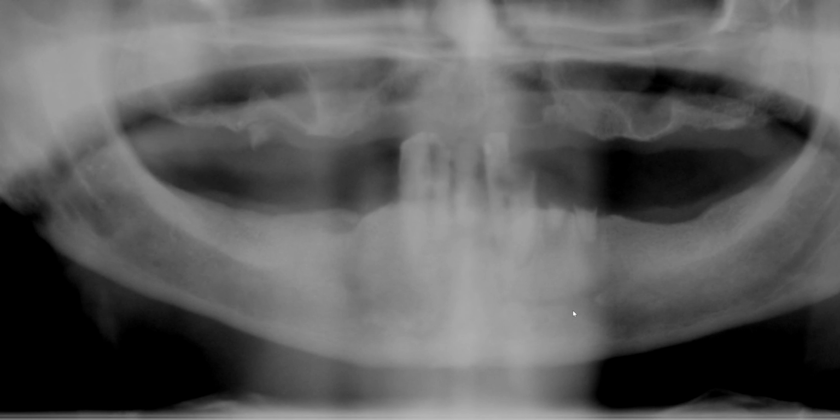So in fact, this had nothing to do with pathology, it's just normal bone. Granted, it does appear a little bit dense. It may be related to this patient's bone quality, but again, this was a normal anatomic feature of the patient. So you can see the anterior loop, mental foramen, and I think we can also see part of the incisive nerve that's coursing anteriorly right here.